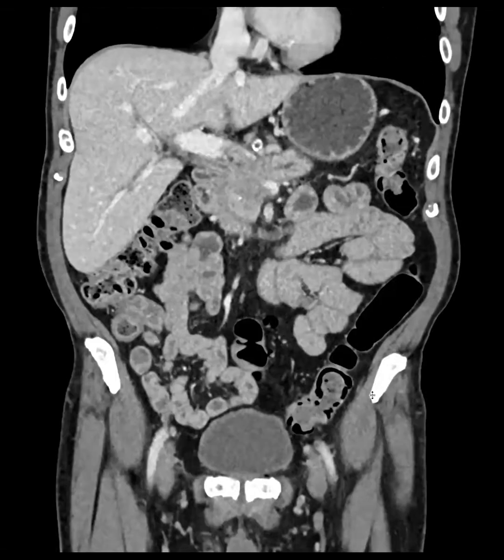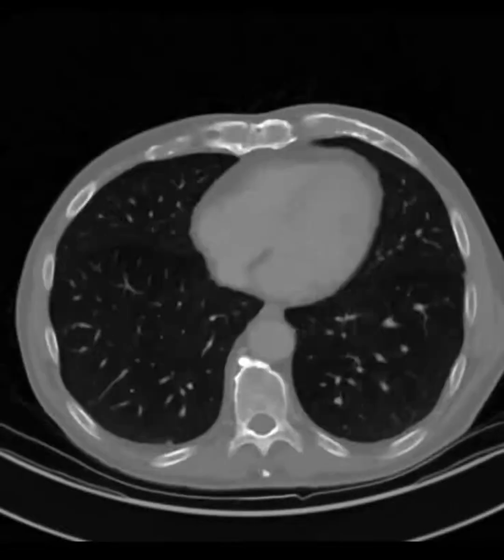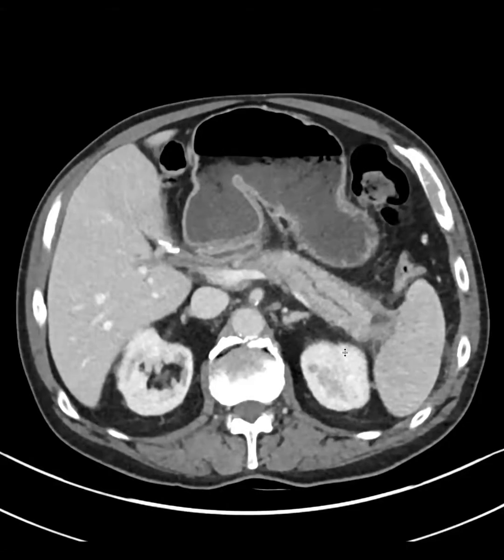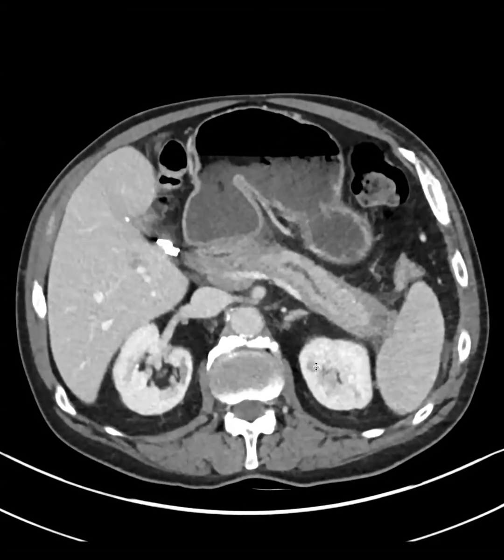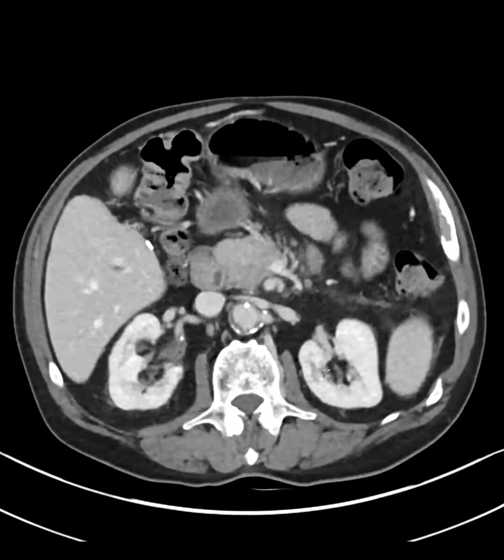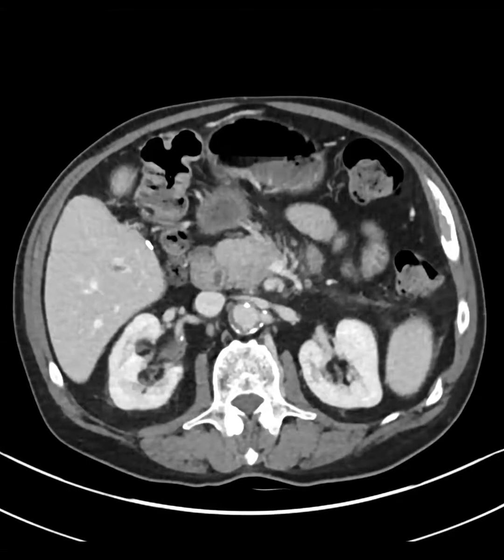This patient came in with abdominal pain. Here's the axial. I'm seeing stranding around the pancreas and fluid. Yep. It looks like, I don't know, I'm thinking IgG4. The pancreatic duct looked a little beaded, like the Guadiana sign, and overall the parenchyma looks a little swollen. And then we've got that rind, like a capsule around it. Yeah, good. And then that comes back to IgG4.